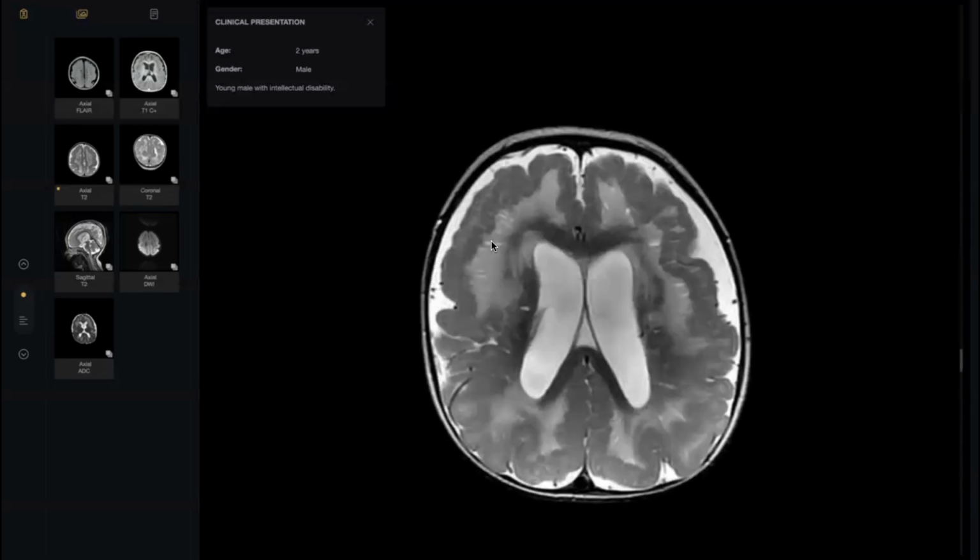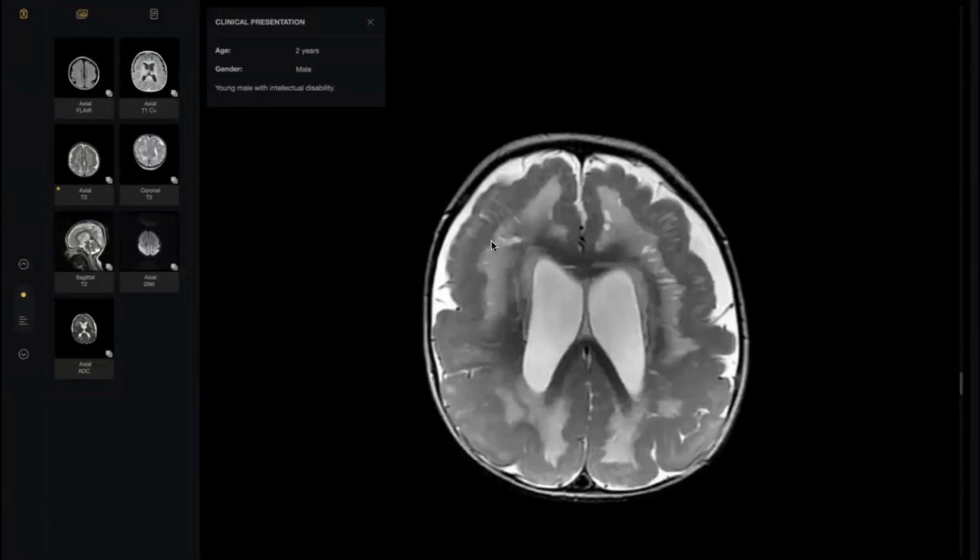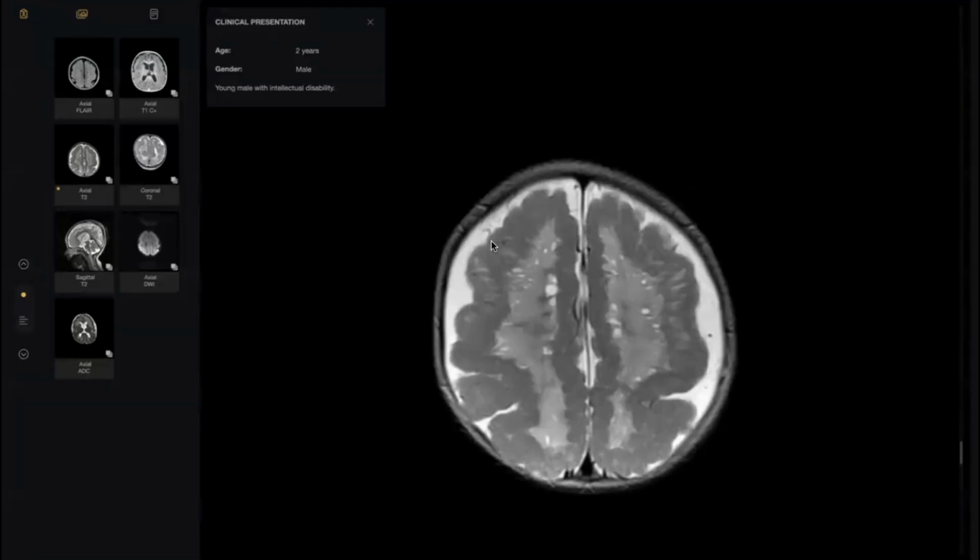This is a leukodystrophy. How to characterize mucopolysaccharidosis: these Virchow-Robin spaces are dilated. I will tell you something non-scientific. The polysaccharide comes and occupies all these spaces, like ice cream spaces.